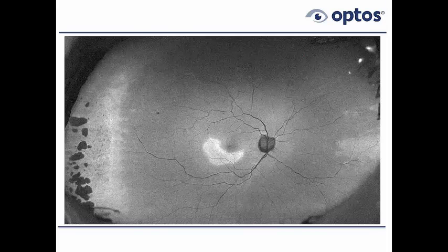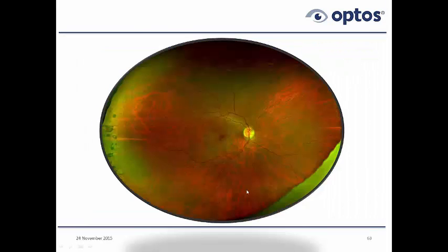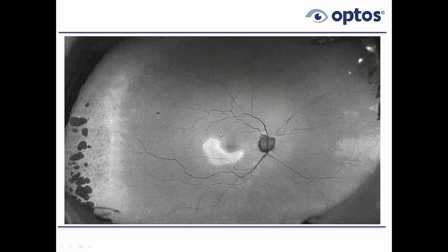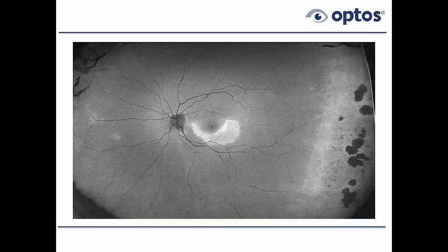So of interest, the macula really looked okay. There wasn't really anything going on here that was obvious. In the left eye, there wasn't much going on. Acuities were 20/20. If I forgot to mention it, acuities were correctable to 20/20, actually to 20/15, if you push her a little bit. So good central acuities. But notice that she has these two lesions below the macula in both eyes.